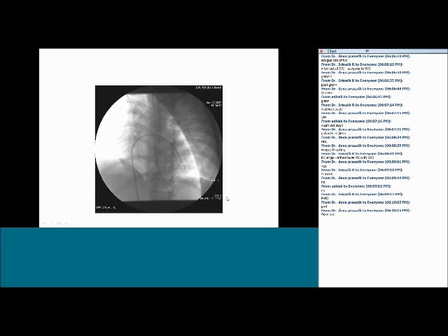Okay, diagnosis. Next angio, diagnosis, and probable age of this child. Probable age of this child. No, that's not the diagnosis. Someone has written TGA, CTGA. CTGA is correct. TGA is not the correct diagnosis. Please see the angios, quiz, please. And what is the probable age of this particular child?